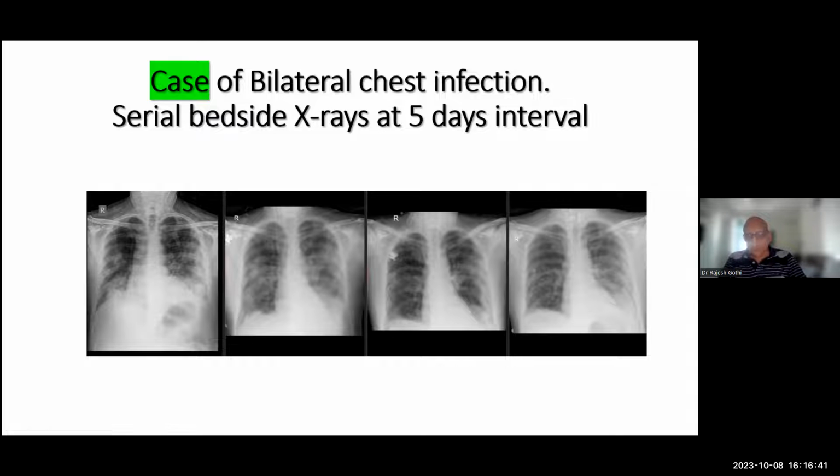So one of the problems with CPAPs is that when you overinflate, the lungs start looking better. This is because the anterior aspect of the lungs get the air inside them, and the chest X-ray is a two-dimensional imaging, and therefore it does not show you what is happening in the area behind the anterior part of the lung, and the lungs look lucent. So when the patient was correctly managed, then the opacification again came into picture.